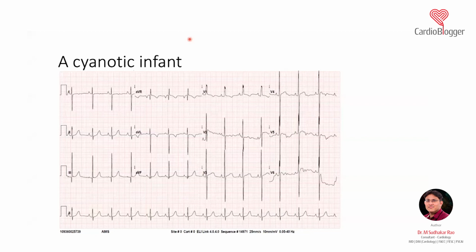However, the important thing in this ECG, let's again go, lead 1, is that most cyanotic heart disease, as per the rule you know, has a right axis deviation. So lead 1 is negative, aVF is positive. Again there is a right axis deviation in this ECG. Whenever there is a right axis deviation, we tend to get some form of positive deflection in aVR.